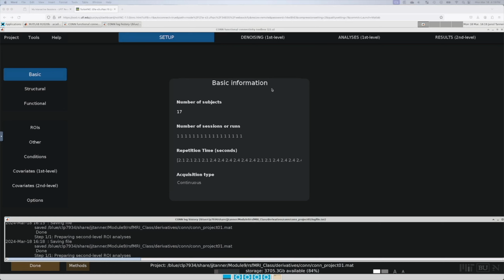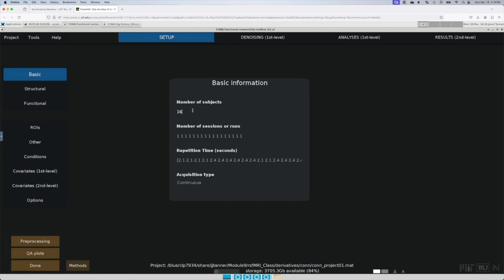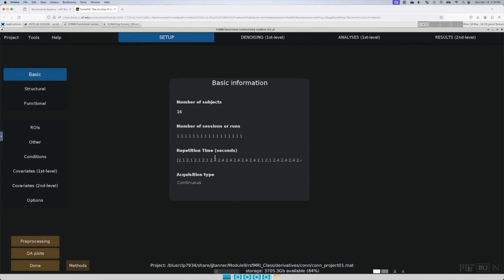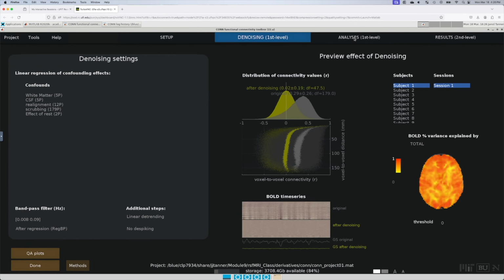That participant removed is now the last one. This is participant 3. We're going to remove. And select yes, remove. And this should be done pretty shortly. Then we will finish up. This is done. We've removed those 4 participants, and we shouldn't have to do anything else because we had already done all the other steps. And again, they're not going to show up here in this list.